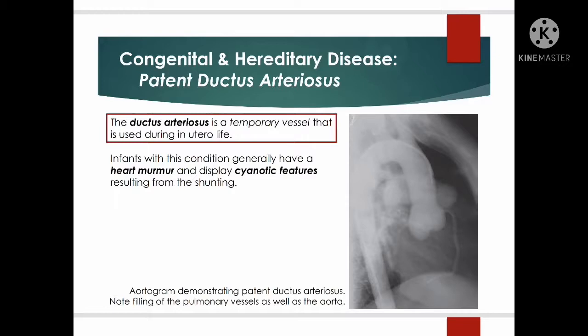Chest radiography is used to show cardiomegaly with prominence of the left side of the heart and ascending aorta and increased pulmonary vascular congestion. When we say cardiomegaly, it is the enlargement of the heart. We measure this through the cardiothoracic ratio. It is measured on chest X-ray, PA projection. It is the ratio of maximal horizontal cardiac diameter to maximal horizontal thoracic diameter.